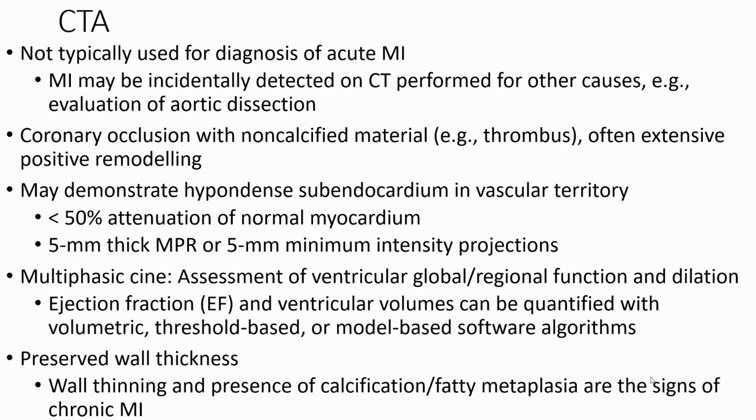Coronary occlusion with non-calcified material, often extensive positive remodeling, may demonstrate hypoattenuation of the subendocardium in a vascular territory, less than 50% attenuation of normal myocardium, using 5 mm MPR or 5 mm minimum intensity projection.